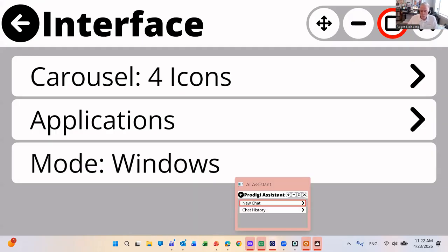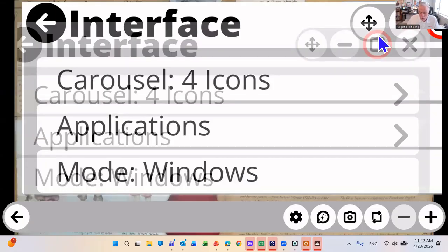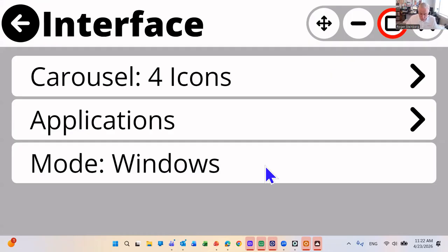So you may be wondering why did we just create this little window here? A lot of Windows applications allow you to click anywhere in the header and drag it around. We have different size fonts and interface options that we need to utilize. So we've decided to go with the four-sided arrow that you click and use to drag your window around in the interface. Okay. And I'm going to show you more about this Windows mode in a few moments, but I'll leave it running for right now, and you can see it there in the upper right, and I'll explain more again why we went with this set of icons that are bounded by that gray area there.